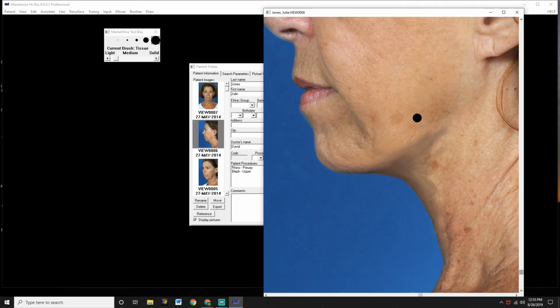She's got a little bit of a shadow right here that I don't like. I'm going to click down in the slightly lighter area. That's a very subtle thing, but it's going to make a difference at the end. Now the line that comes down here on the side of the mouth, I want to soften. I don't want it to go away because we know it doesn't, but I want to demonstrate that it won't be as deep by just clicking down in the lighter area, dragging it across the darker area.